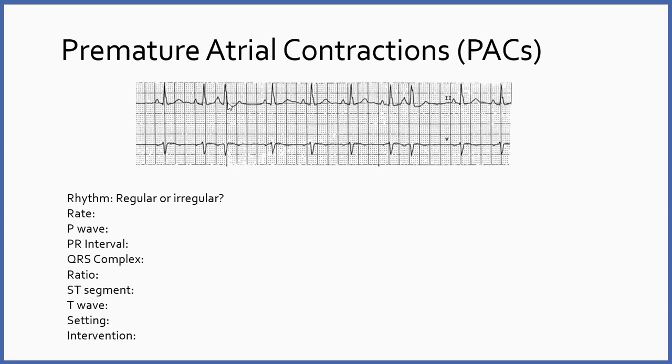Like I say, this is kind of an interesting finding. That's why I kept the strip, because I thought it was interesting. All right, so we've established we have an underlying sinus rhythm.